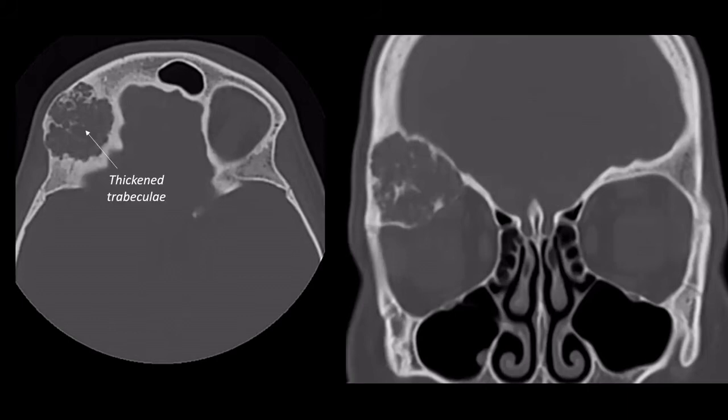And the presence of thickened trabecula is very characteristic for one specific entity, namely a bony hemangioma, which is a benign vascular lesion which causes lysis of soft bone but compensatory thickening of trabeculae, leading to trabecular thickening centrally within the lesion.